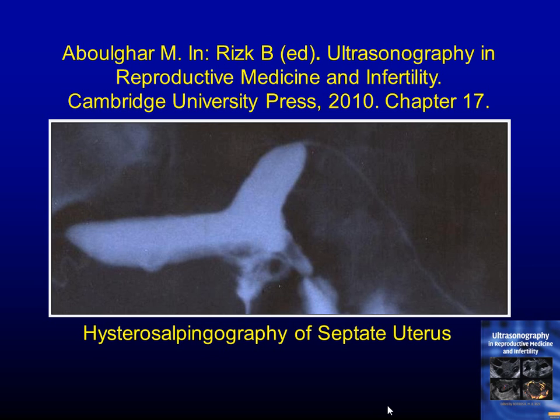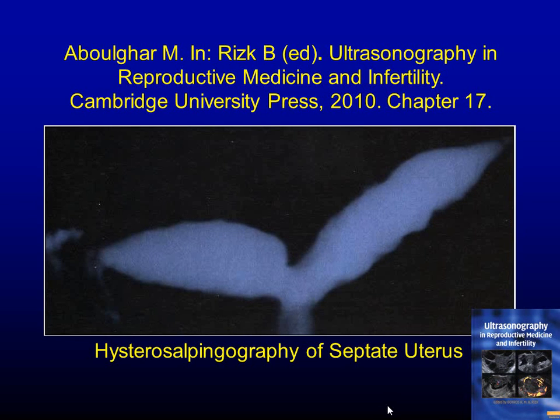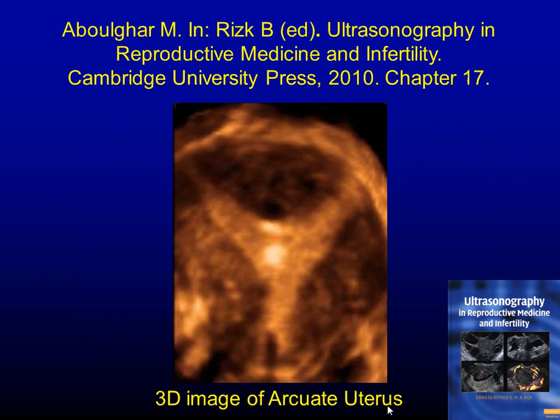And at some point I'll show you a cartoon showing the different evaluations of the same patients with the discrepancies between one imaging and the other. So this is as far as X-ray. Again, this is an extreme form. Look at that. One side of the uterus is almost up to her right iliac crest, and then the left side is hanging above. This turned out at laparoscopy to be actually a septate uterus, not a bicornuate uterus at all. So this was the X-ray.